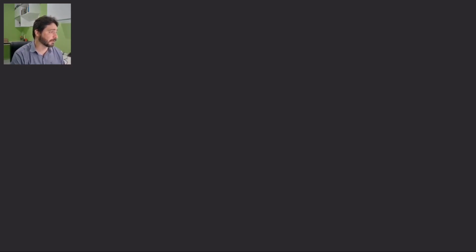Let's suffer during the work, not before it, and see what we can actually take from this exam. So this is a large exam. It's downloading really fast. We are less than 50 seconds from looking at the images.